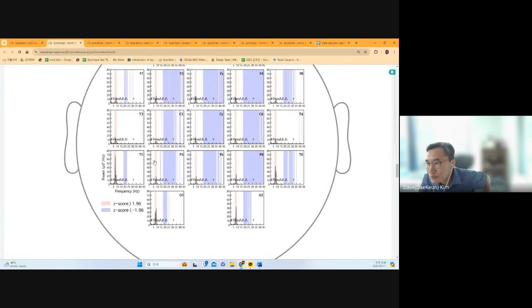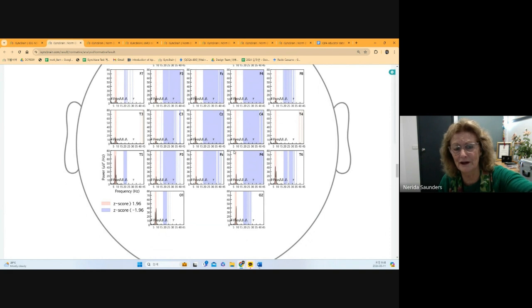You mean this red and blue color? Changing the red and blue color to the bright one? Yeah, and reduce the graph to only 50 here, to 50 hertz, right? Yes. So that you get more of the actual shape of the power in the graph.